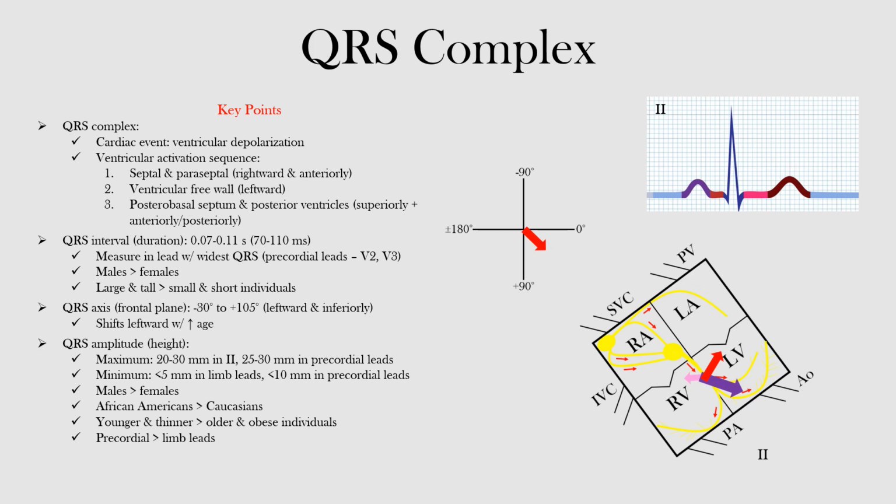So if you look here, this is our QRS complex, this would be our P wave, this is our T wave. We have our PR segment, or PR interval. Okay, this is our PR segment. All right, this would be our ST segment, starting at the point of our J point, which is there. And then we have our QT interval, all of this. So that's just a quick review.